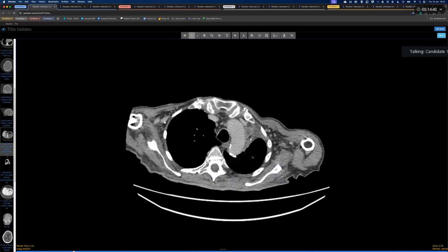Okay, so this is a neoplastic process, most likely. The necrotic lesion over here could be a necrotic lymph node, or a squamous cell carcinoma that undergoes necrosis, or non-small cell lung cancer, giving metastasis to the bone on the right scapula and to the brain. I would like to complete the study by checking the lung window and the bone window, and I would like to manage this patient by conveying the findings to the referring doctor and referring the patient to the oncology MDT for image-guided biopsy, histopathology, and to be managed accordingly.